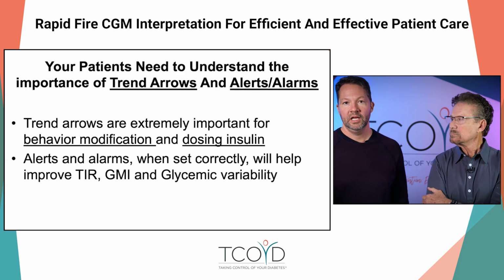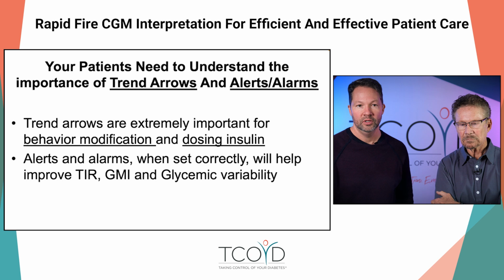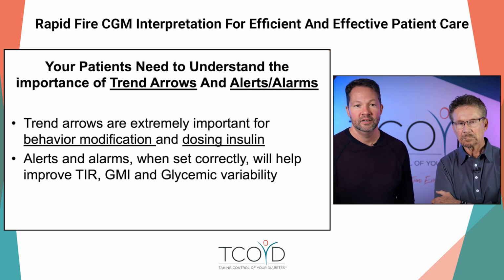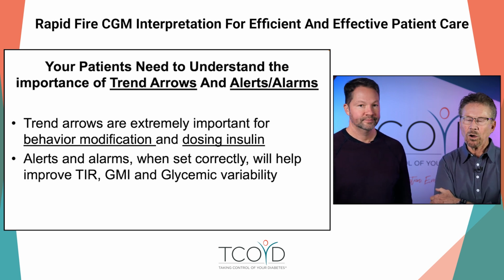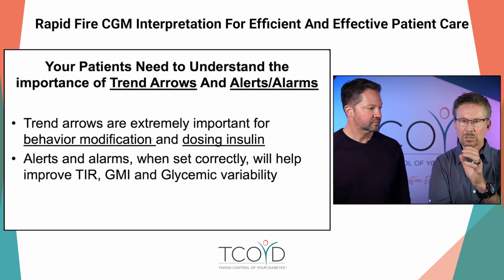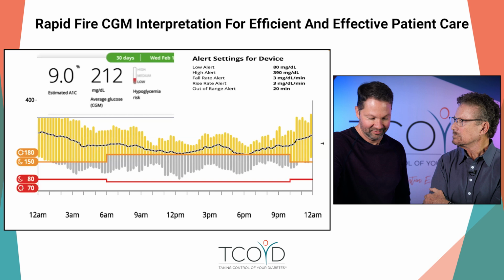Now, this is more of a real-time feature. This isn't something you're going to be looking at necessarily in the downloads with patients, but it's so important. So we say it's extremely important for behavioral modification and dosing insulin, and the alerts and alarms, when set correctly, will help improve all these things. Yeah, I always say that if you set your alerts and alarms correctly, you can improve your time in range 10%.